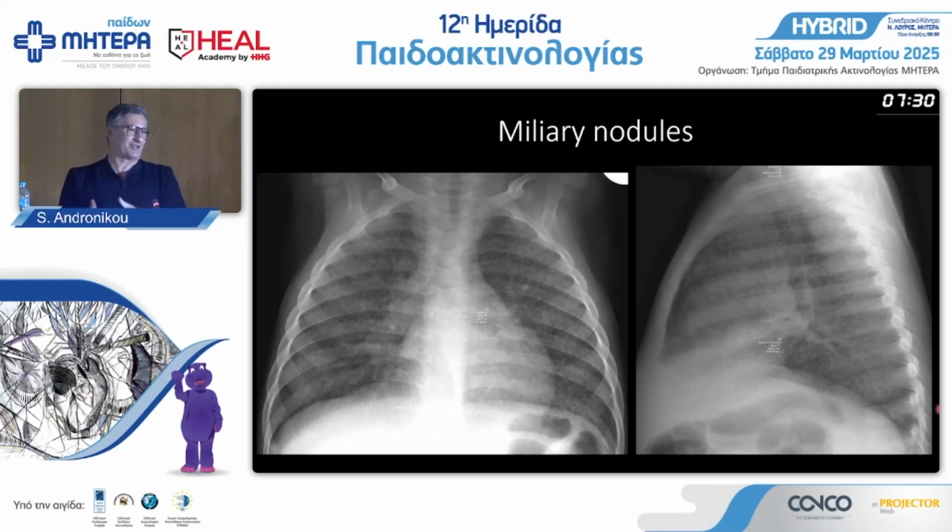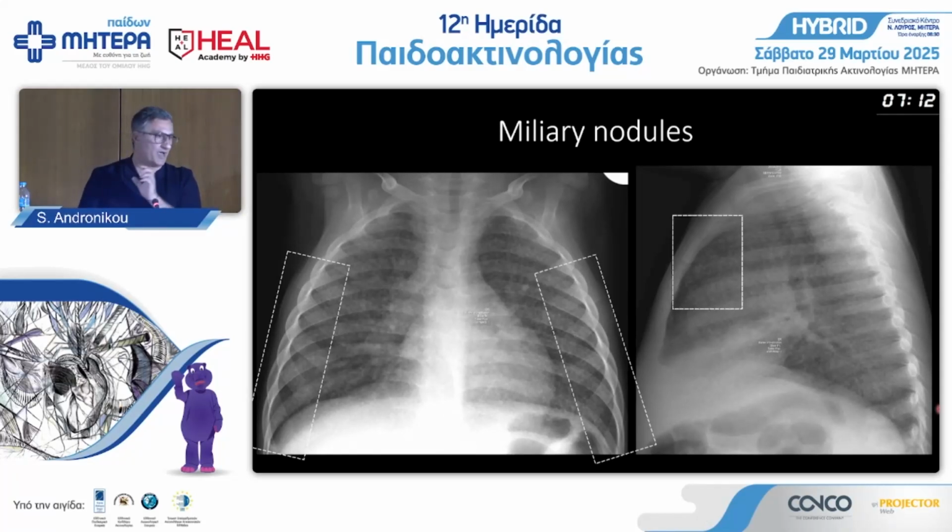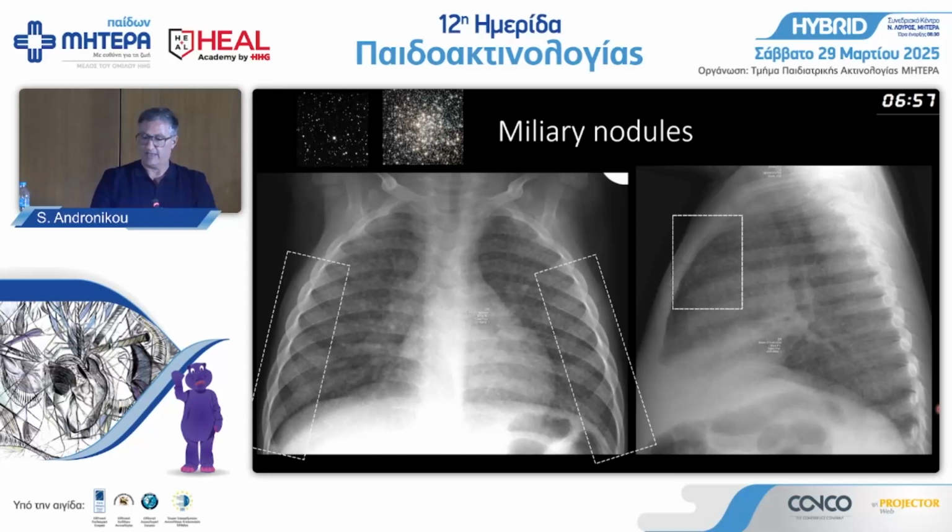So if you have a question about a patient and the mother tested positive, again, the right clinical scenario, where do you look to be sure these are not blood vessels? As usual, look at the periphery. You shouldn't see blood vessels completely to the end of the lung. If you see nodules in the outer third, I recommend you look behind the sternum as well, despite the fact that there can be a thymus. In TB children, the thymus is shrunk, and sometimes you can see the nodules. So these are great places to look to say, oh, I do think those are nodules. Look in the costophrenic angles, look retrosternal.